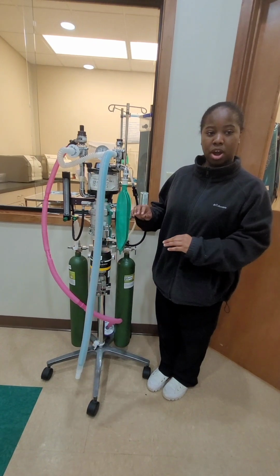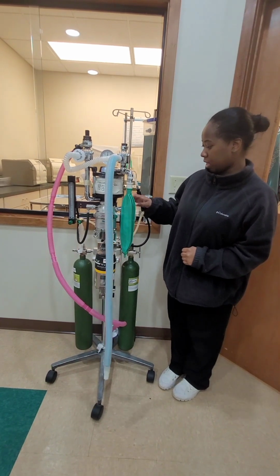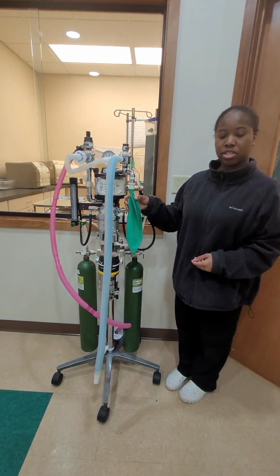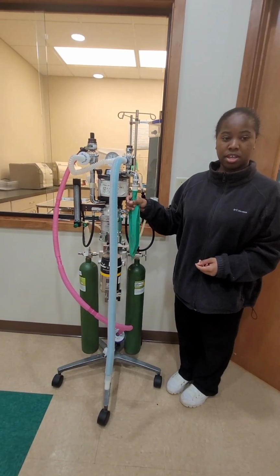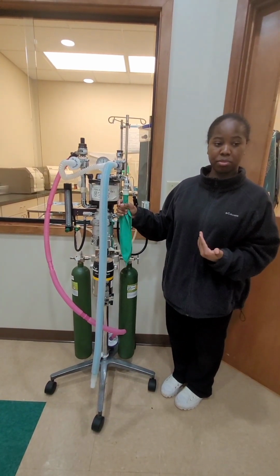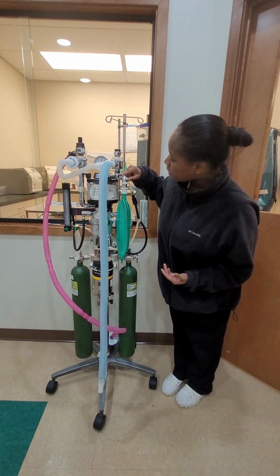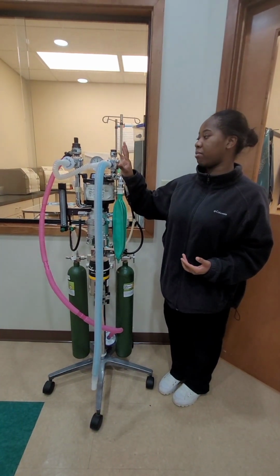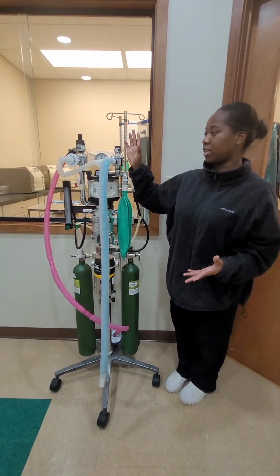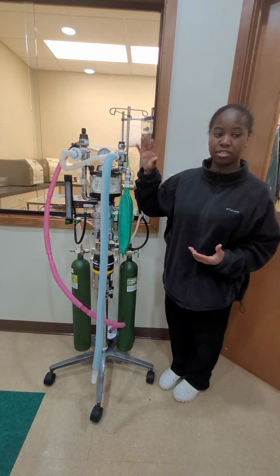Afterwards, we go to our vaporizer outlet, and it goes in through this tubing to the reservoir bag, where it holds the O2 inhalant mixture so that a breath can be given to the patient. Afterwards, it goes into the inhalation valve here, and we have our negative pressure relief valve up here as well, to make sure that there's no negative pressure before it gets to the patient.